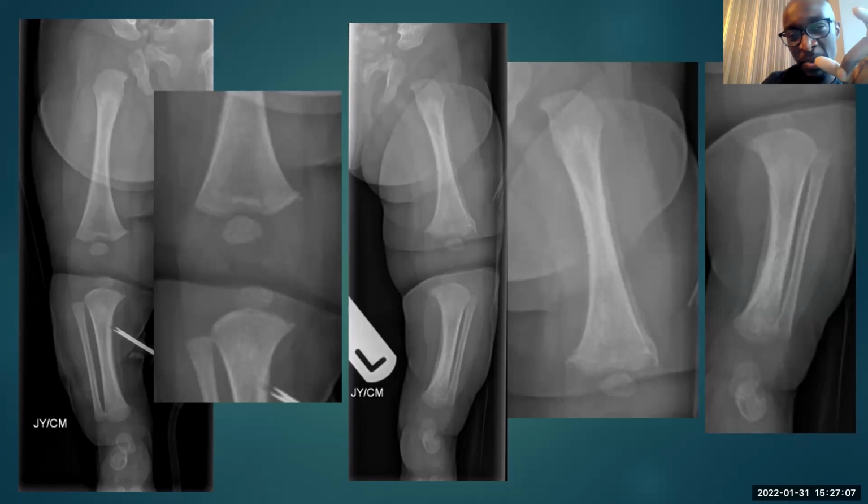And these are the buzzwords that we use because those types of fractures, again, are very sensitive and specific for NAI. So this little chip, which is off this corner here. So we're going to call this one an acute fracture. Do you remember? Acute healing, acute healing. That's the language that we use when we talk about NAI reporting.